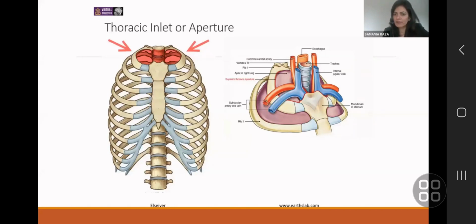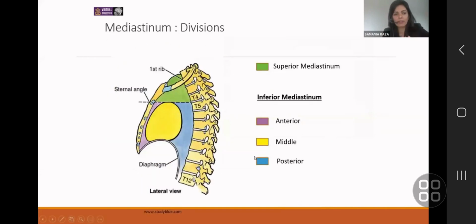And that's technically a sterile area, but it's still a risk for future metaplasia or malignancy or infection, because it's dead, non-functional tissue sitting there. So that's the thoracic inlet imaging.